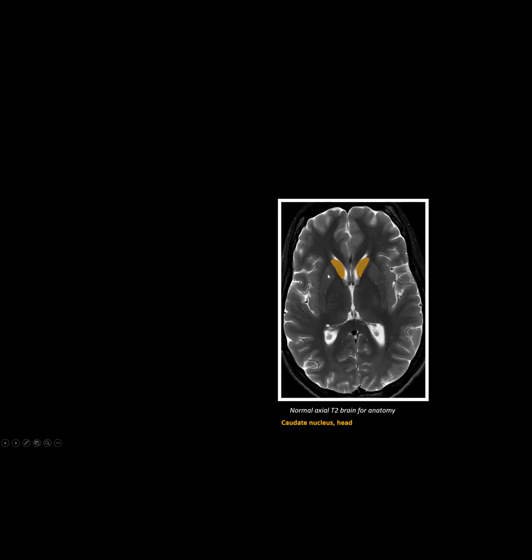It's like that side. So this is the lentiform nucleus. The putamen's on the outside, the globus pallidus is going to be on the inside. What structure is this over here that we just talked about, on either side of the third ventricle? Your arrow is pointing outside of the brain, so I don't know where you're pointing. I can't see. Oh, okay.